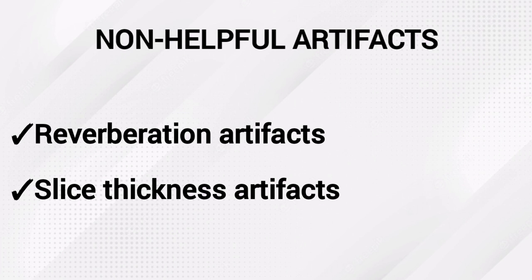Now it is important to recognize artifacts and appreciate their significance, and thus avoid potentially important diagnostic error. Only appropriate education and experience can alert the operator to the possibility and recognition of artifacts.